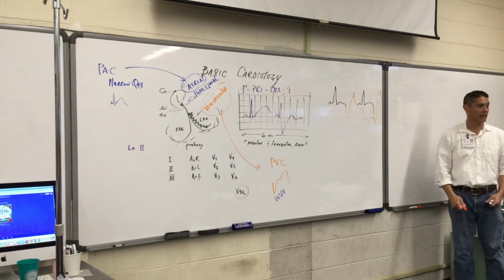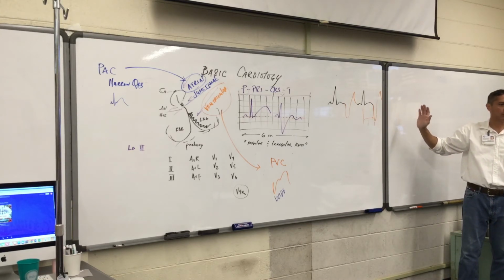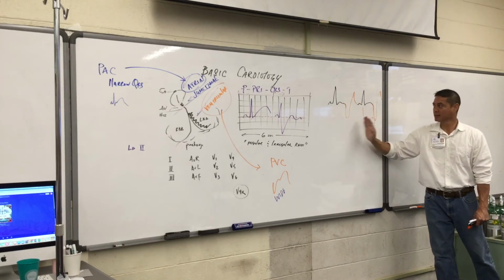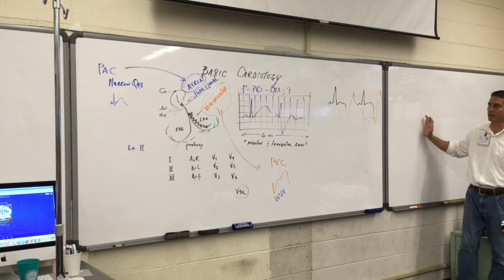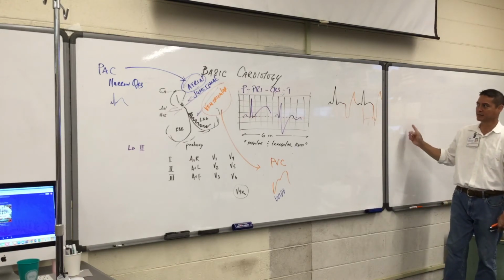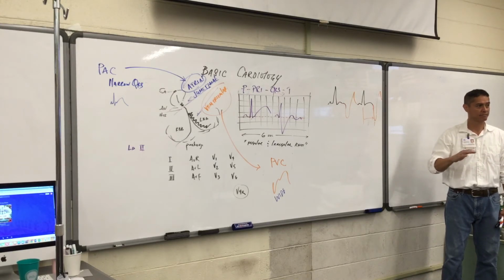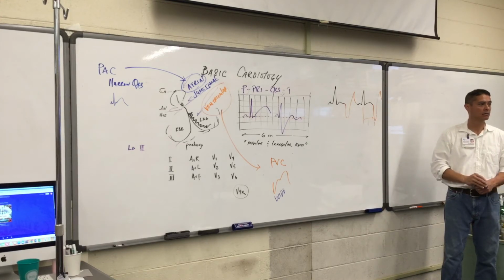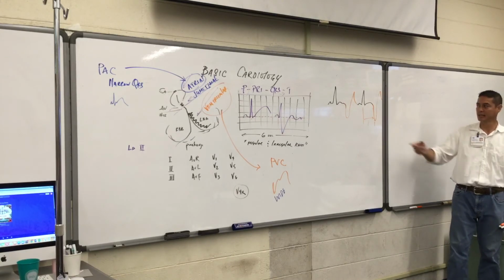We have a sinus rhythm with an overall rate of 80, but we have 1, 2, 3, 4 ventricular ectopy. So what they're going to end up reading is, well, wait, there's an overall rate of 80, so they have 8 complexes, and we have 4 of those that we took half away, that don't generate a pulse, and we wonder why our patient now is feeling lightheaded, faint, and can't stand. It's because these have very little stroke volume when they cause this contraction, and there's no pulse felt.